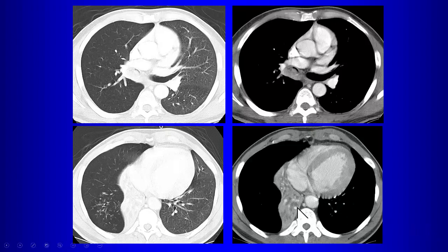So those are airways that are filled with secretions because there's obstruction here, so the air can't get in it, so it fills with secretions. So instead of air bronchograms, you have secretions filling the bronchi, and that's what you're seeing here on the CT. So what is our differential diagnosis? Oh, by the way, what is this stuff? Yeah, those are tree-in-bud nodules, so it looks like a little bronchiolitis there.